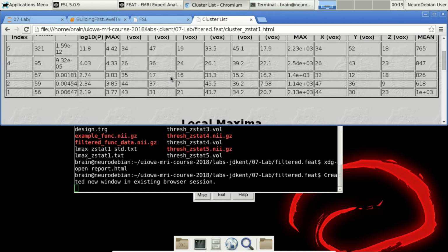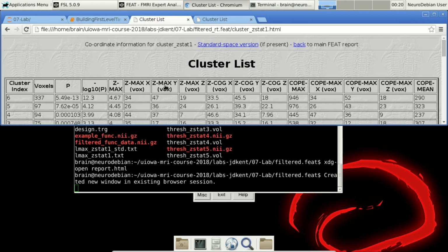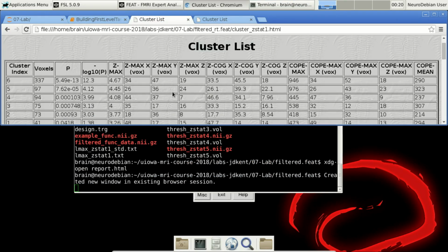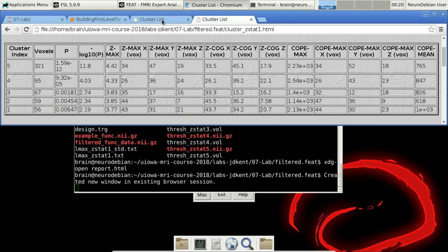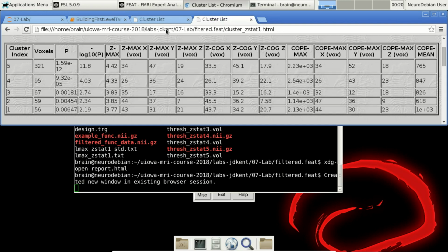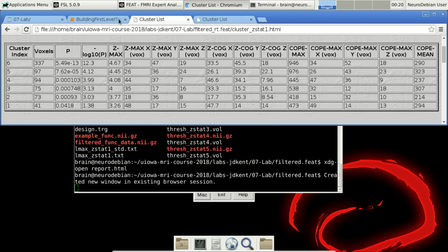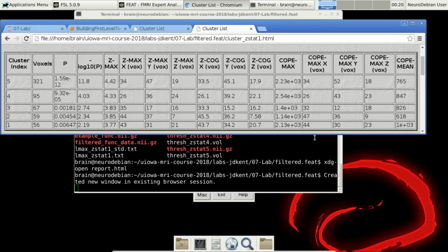You can click on this. I can click on this one. So it looks like we probably added another small cluster. And all the clusters generally appear to be a little bit larger for the congruent stimulus. Alright, but I can leave other visual modifications.